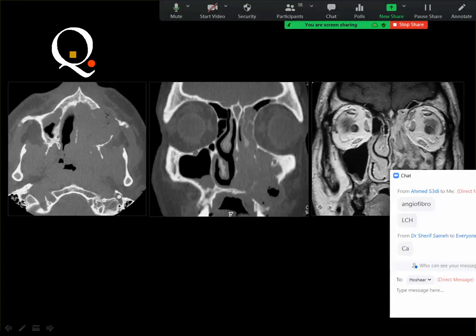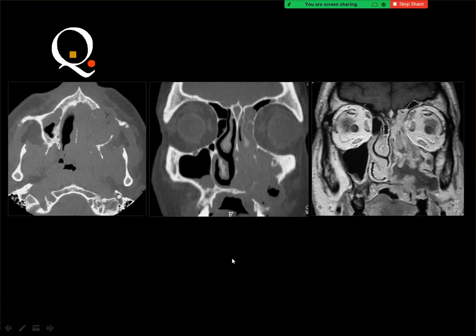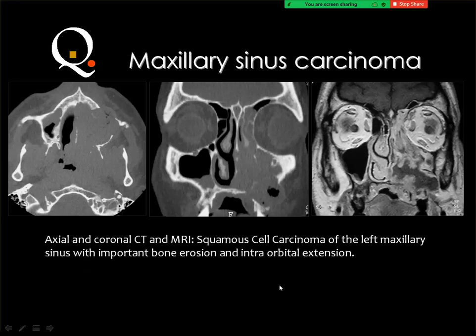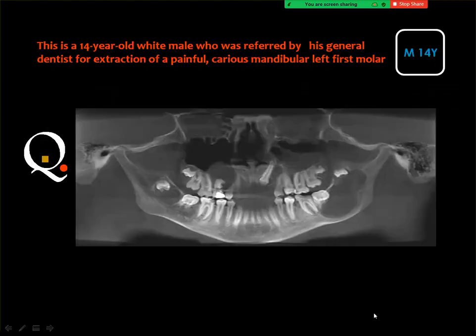Yes, you consider carcinoma. And if you feel that this is only an expanding lesion without bone destruction, you should revise your feeling, because there is significant destruction of the anterior wall of the maxillary sinus, the medial wall, the pterygoid plate, and part of the bony nasal septum. Then whenever you see destructive changes, first of all, on top of the list is carcinoma.